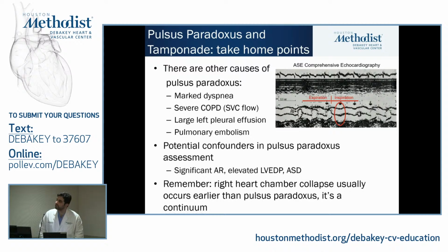So, in practice, you will not necessarily see cases where all the features of tamponade are present, or none of them are present. You're going to have cases where there's variation, where some features are present but some are not. And remember that the imaging findings should really guide the management, but the management should really be decided based on the clinician's assessment and the patient's presentation. So the findings on echo may be present at an earlier stage compared to the clinical manifestation of tamponade.